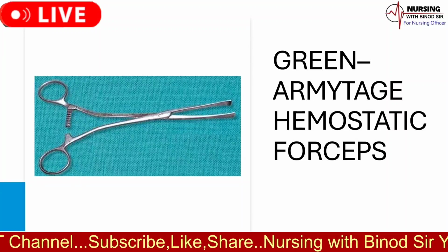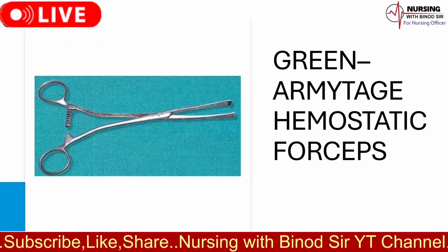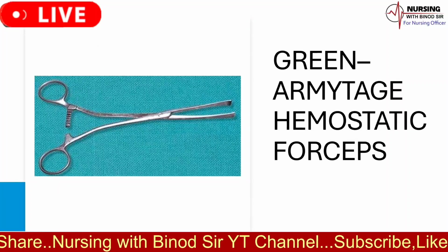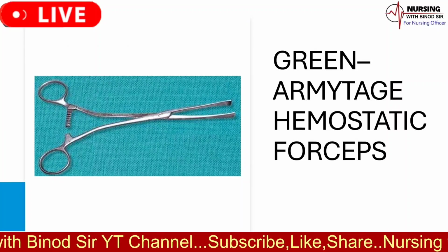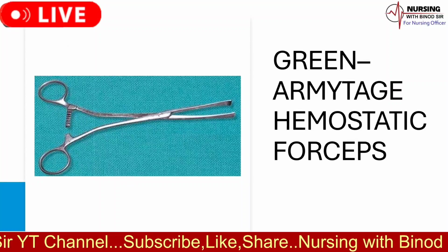3. Hysterectomies. In hysterectomy procedures, Green Armitage forceps help clamp and secure tissues, making the operation more efficient. 4. Grasping uterine ligaments. The forceps are used for securely grasping uterine ligaments during various gynecological surgeries. 5. Postpartum hemorrhage management.